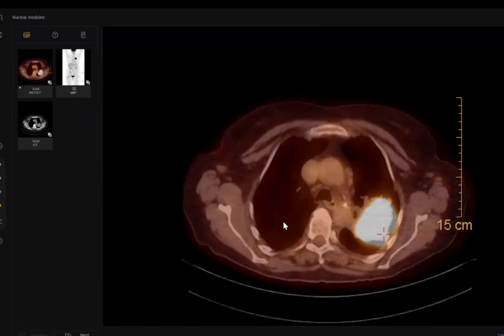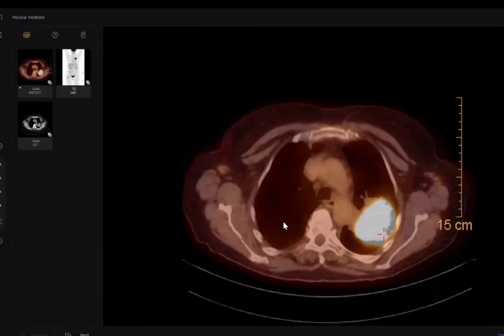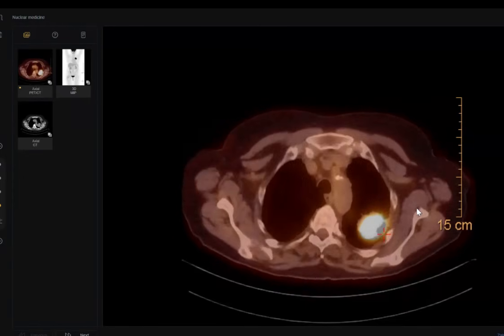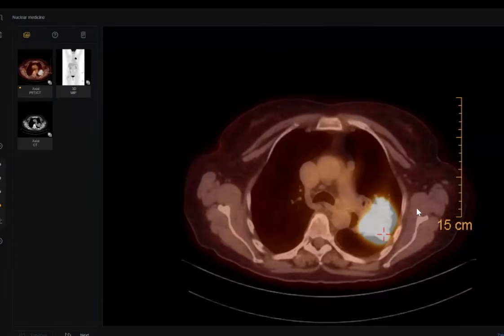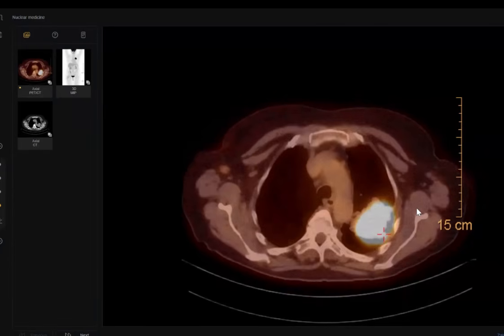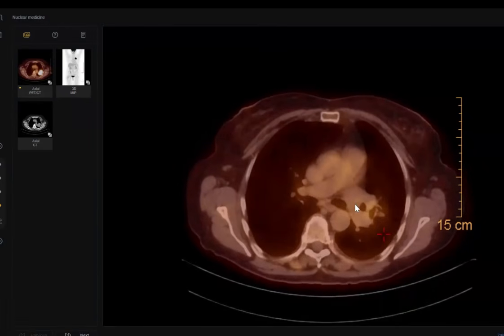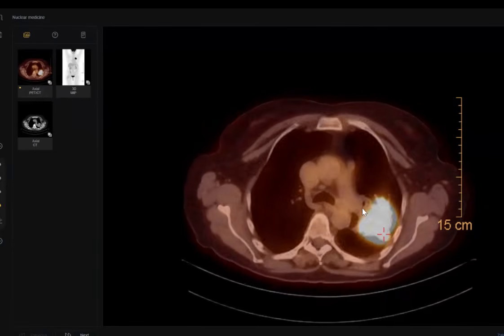Okay. Besides that, CT staging. And if I'm asking about some intervention, why? This lesion is almost peripheral and sits here touching the chest wall. Okay. I think it is very far from being biopsied through endoscopy.